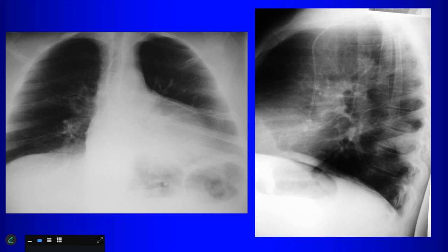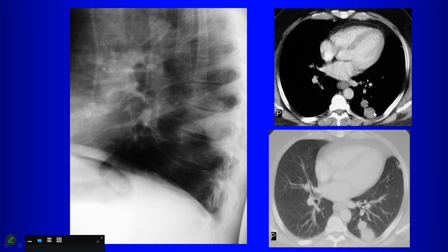Left lung base. Do we see anything on the lateral view? Yeah, right at the neuroforamina. You notice this neuroforamina is nice and lucent, this one is lucent, this one is different. There's a mass here. That's cancer projecting over the neuroforamina in the left lower lobe.